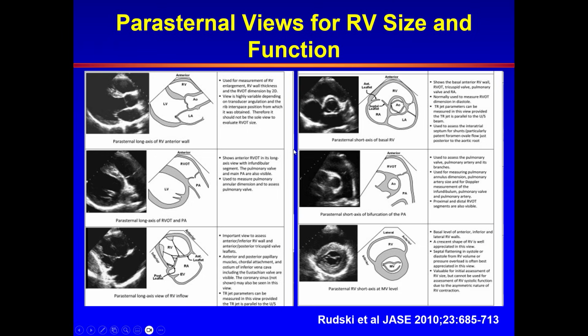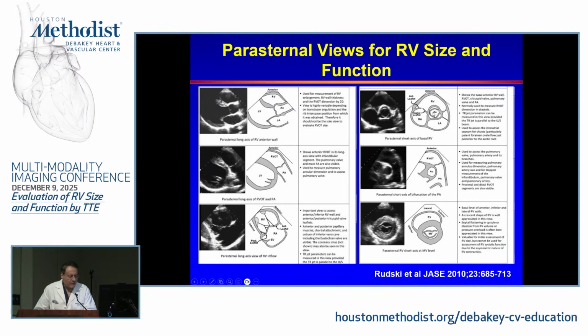and draw our conclusions about PA pressure. The parasternal short axis view at the level of the aortic and pulmonic valves is shown here. It's another chance to look at the tricuspid valve leaflets, anterior and septal, and therefore you can align again with TR. You look at the size of the jet, and you get the jet with continuous wave Doppler. We look at the interatrial septum. We interrogate the interatrial septum in this view.